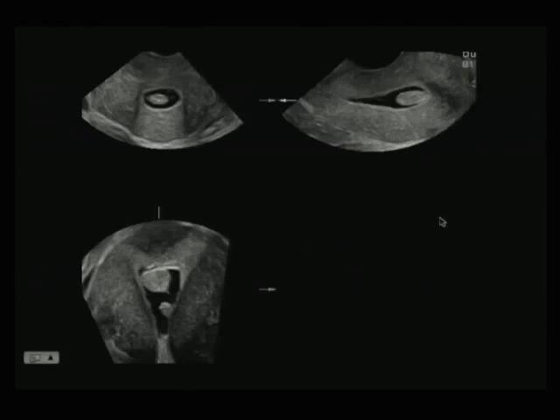And here's another example of the polyp. Now, if you were to just do a regular 2D exam, you might have only found this one polyp, which we can see longitudinally or transversely. And if the operator holding the probe had not noticed the other smaller polyp, perhaps a picture wouldn't exist of it.